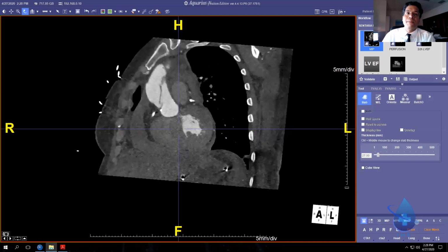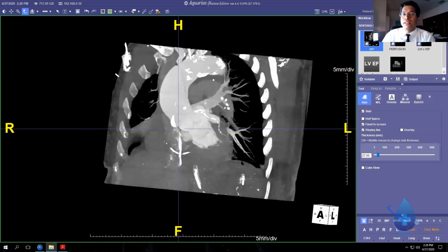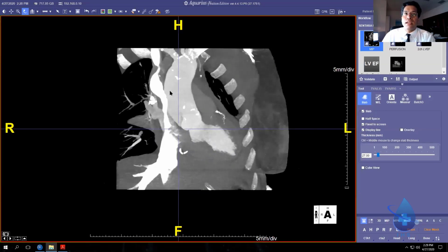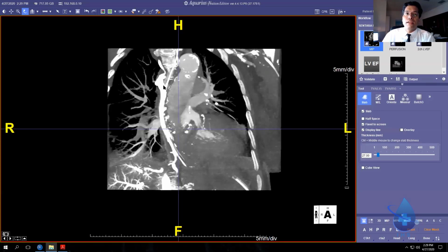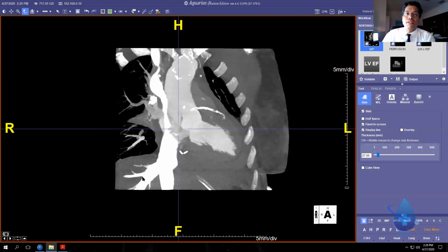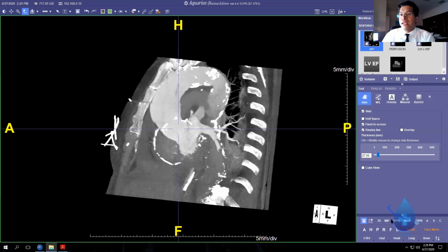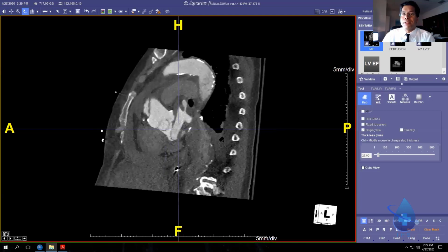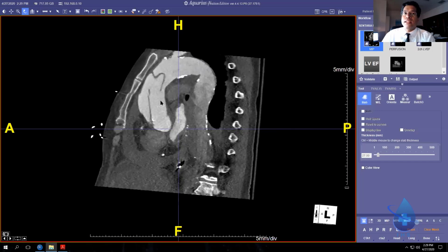And because the patient's in tamponade from dissection, the azygos fills with contrast retrograde like this, and the contrast bolus also refluxed backwards into the hepatic veins and IVC. This was so bad, tamponade was so severe, her blood pressure was 35, 40 by the time I got to the CT scanner. The contrast you'll see doesn't even make it down the descending aorta.